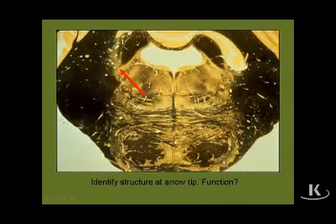Next, the first point we want to make with this myelin-stained section is that we're looking at the brainstem. And the issue is what part of the brainstem? Well, it's got to be a part of the brainstem that has a large opening that separates the brainstem below from the overlying cerebellum. That large opening is the fourth ventricle. So it can't be in the midbrain because the midbrain only contains the cerebral aqueduct. And the issue is, could we be in the upper part of the medulla? If we were, we would see a very large and obvious inferior olivary nucleus, which is absent in this particular slide. So what we're looking at by default is a pons section.